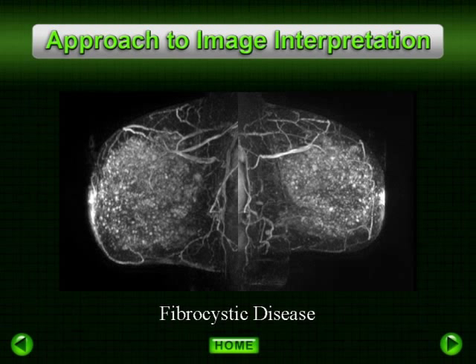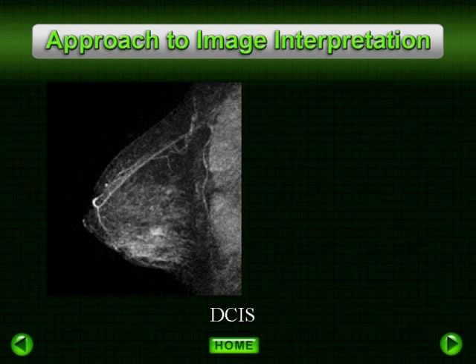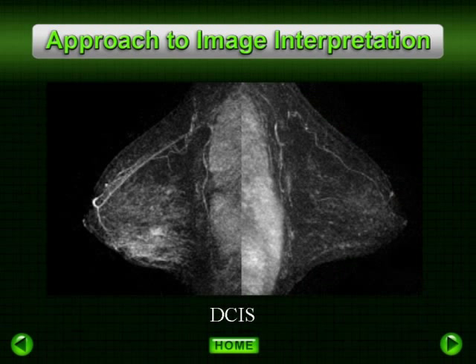It is critical to evaluate the breast bilaterally and very early on in the parenchymal enhancement. Here is again demonstrated relatively diffuse, non-mass-like enhancement within the right breast. What is its significance?